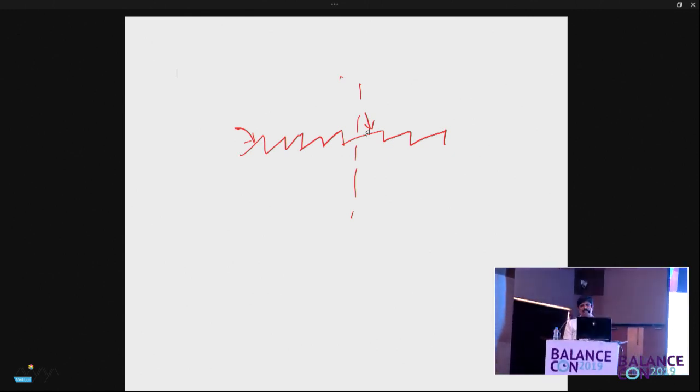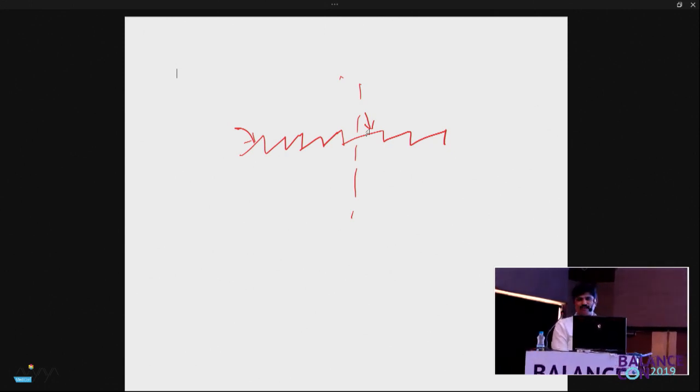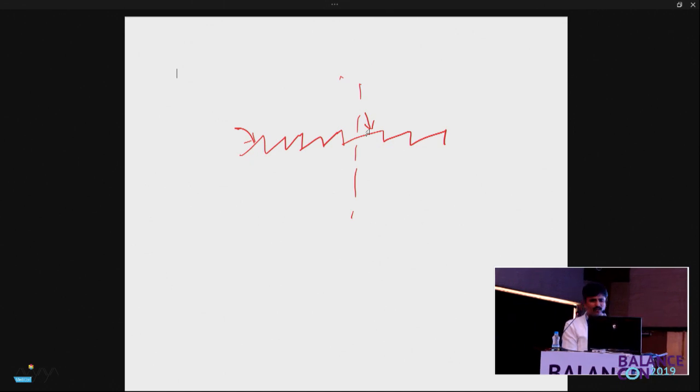So the same thing is also written down in the values that you can see, the slow phase velocity in the prefixation window versus the fixation window. The slow phase velocity is much lesser in the fixation window compared to the prefixation window. The next thing is something big we are going to do.